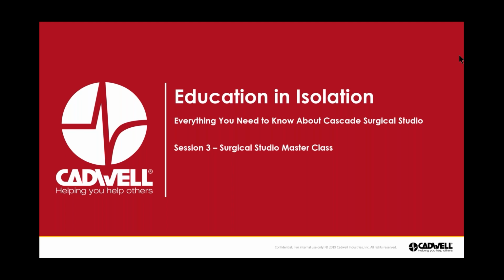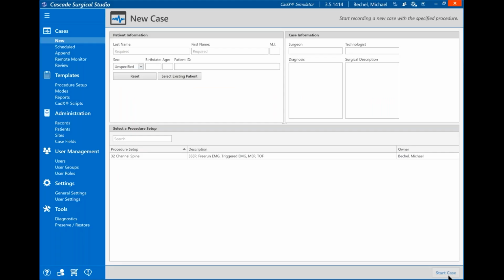Right now, I've brought up my Cascade Surgical Studio application, and we were working today with the menu on the left-hand side. We pretty much covered the case section during session 1. Templates were mostly done with session 2, and today we'll be doing the masterclass items here from administration on down. Starting with administration of records.